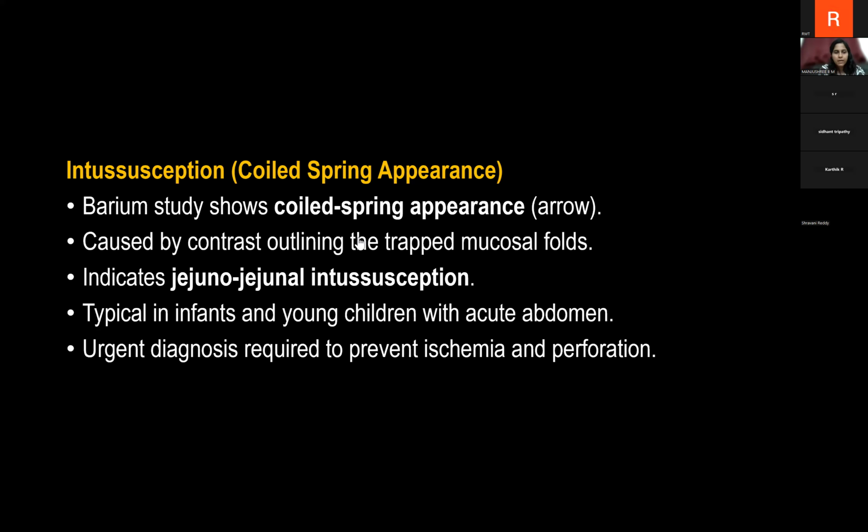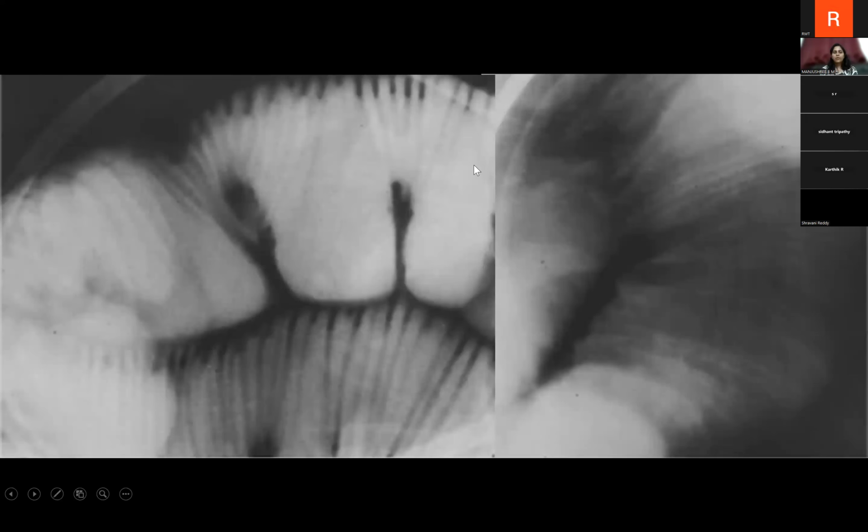I'll tell you how to differentiate it from scleroderma. Next spotter. Yes, Priyam, right answer. This is scleroderma. This is the hidebound sign, seen in scleroderma. Very good. I can see so many of the students answering right and many others attempting it. So this is hidebound sign seen in scleroderma.